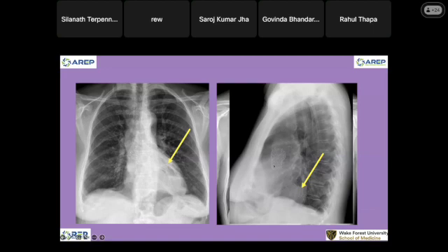Maybe it's somewhere in here in the left lung, and then the trachea is shifting. What is that? So this tells me something, and you see it here too: there is volume loss in the left lung. It is pulling everything to it. What causes lung volume loss?